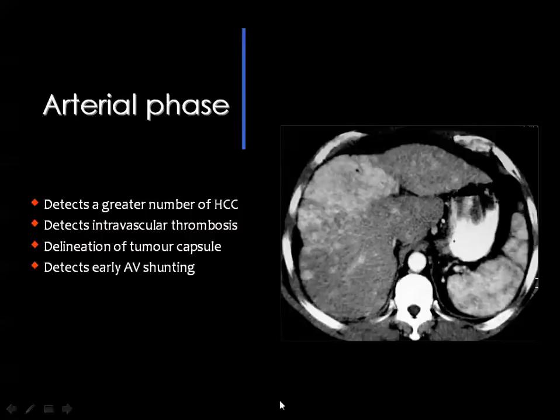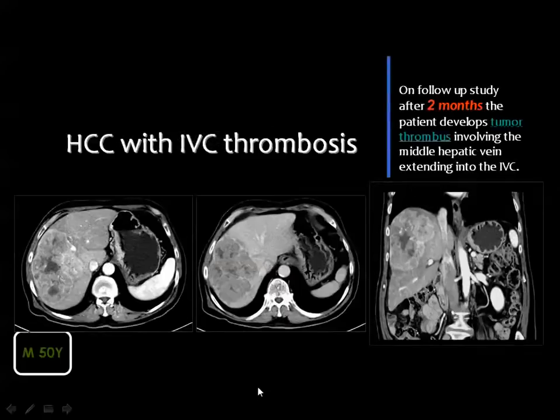But in the arterial phase, if you see this appearance and you got enhancement, whether nodular or focal or mass or patchy or diffuse, then you suspect or you should consider the possibility of hepatocellular carcinoma. And this is a multifocal disease. You see a big lesion here, and all these enhancing nodules belong to the tumor as well. Then this is the CT scan.